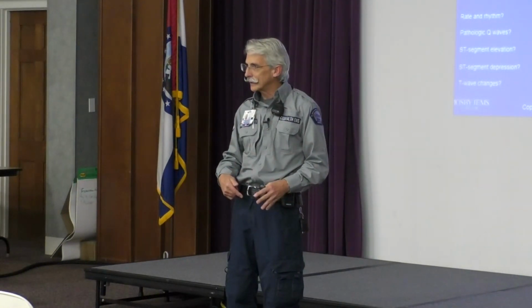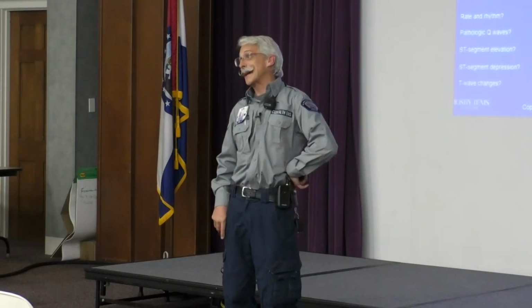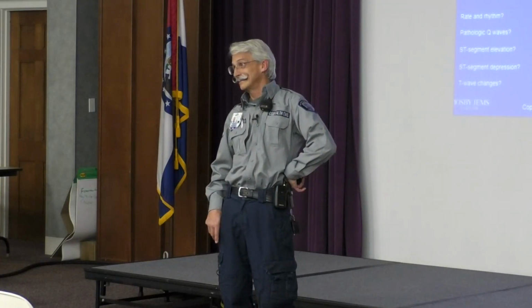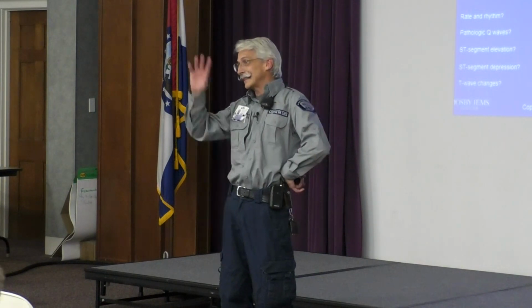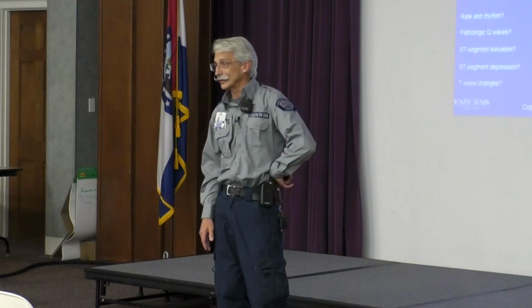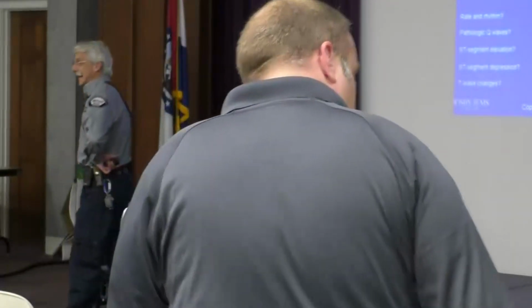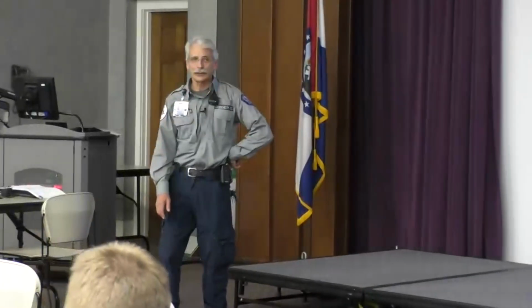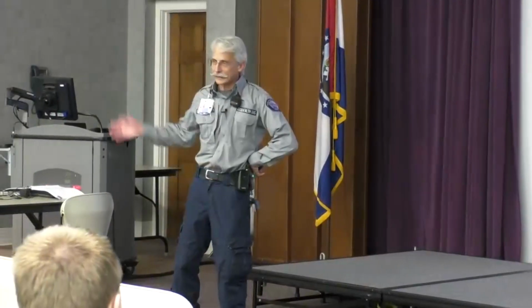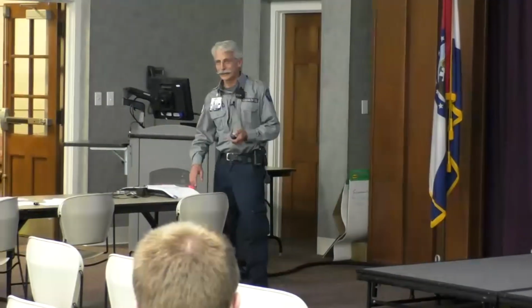What's that tell me? Whether 2, 3, or AVF have anything in them, and if they do, I'm not giving nitro. Now I still need to do a 12 lead, but I know when not to give nitro at this point. It's not the only way in the world to do it. It's just a thing. It is a little bit of a cheater's way.